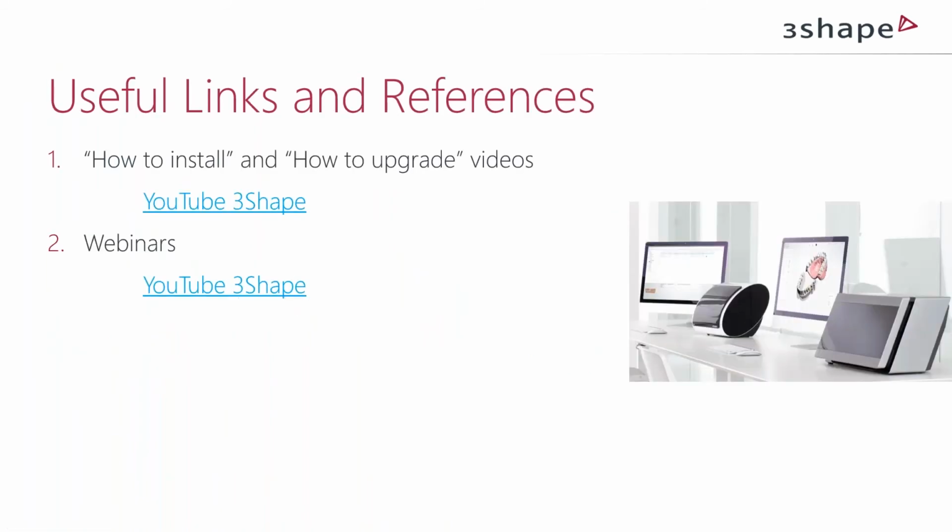All right, I think for today, this is actually the same. We have now learned how to install the software as a standalone, how to upgrade from different versions, then also how to install client-server, and also how to uninstall the software, how to backup cases, and where to find the information about that. And I would also like to share some links and references for you.